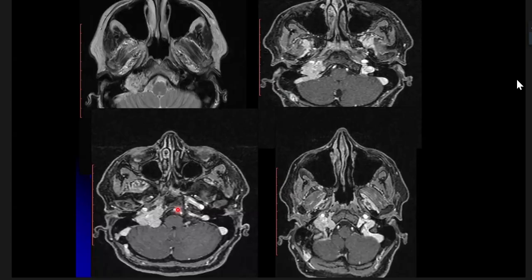Take the MRI for the same patient and tell me. Sir, intensely enhancing lesion noted in the right jugular foramen with prominent flow voids. Excellent. So salt and pepper appearance on T2 weighted images. And you have an intensely heterogeneous enhancement extending along the course of jugular foramina. Where it is trying to go? So it's going extracranially along the dura, adjacent to the hypoglossal canal.